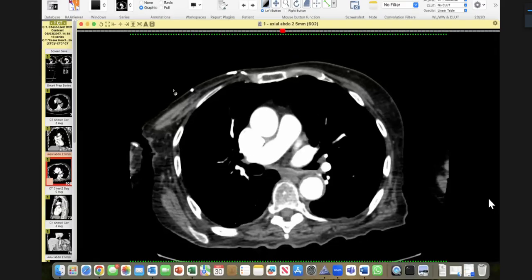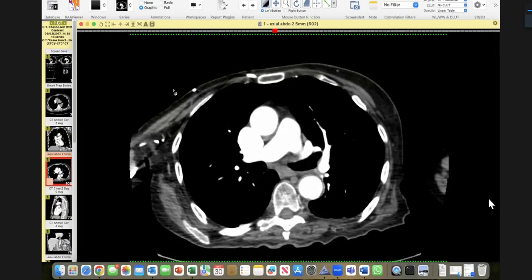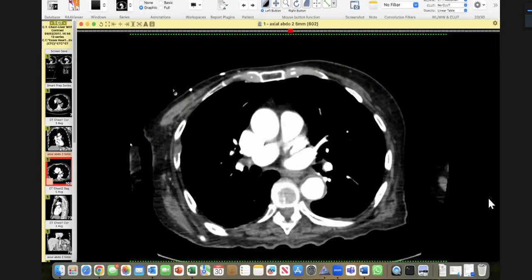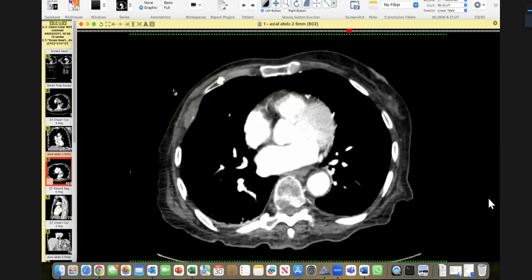Here it is. The bronchi would be appreciated more. I mean, the main bronchus and the upper branch are apparent on the mediastinal window. Anything else? Any other window you want to see? One second, I just finished examining this window till the end.